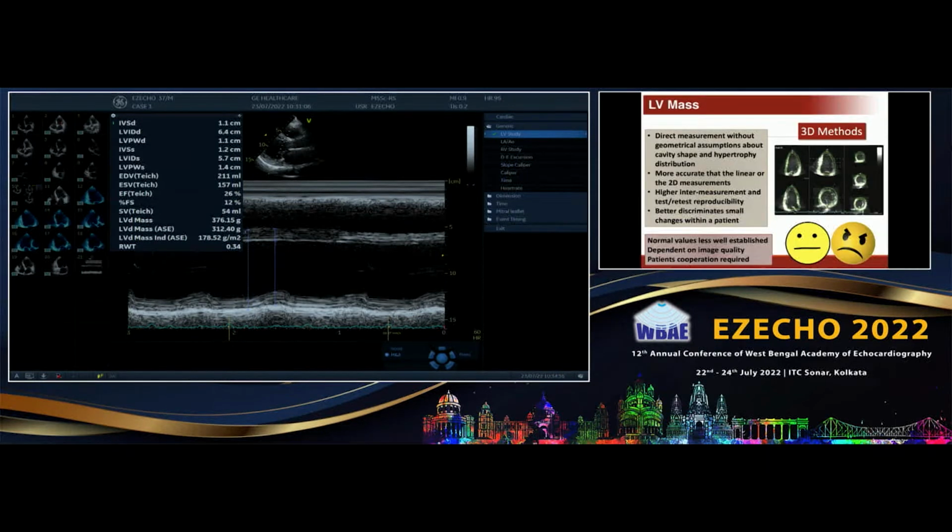Correct. Next, we quickly go to the LA volume because we have only 10 minutes left.